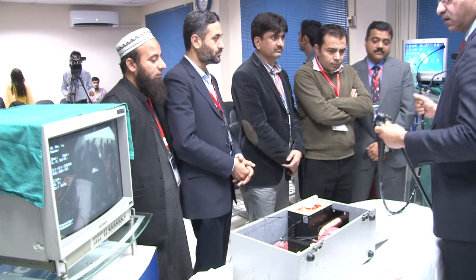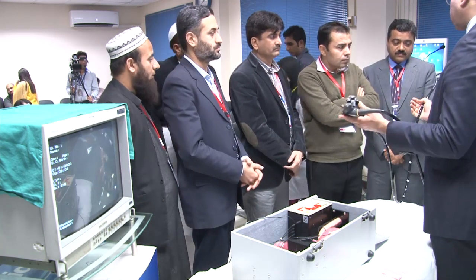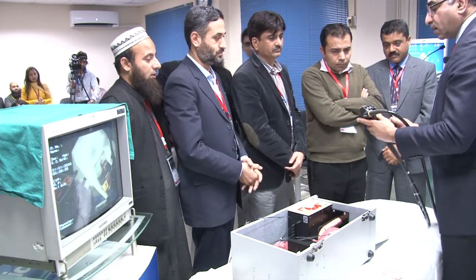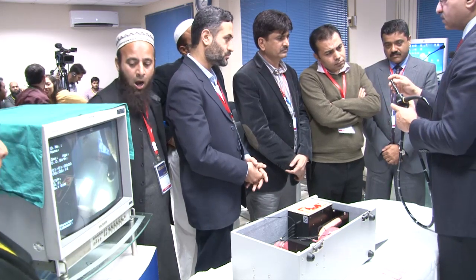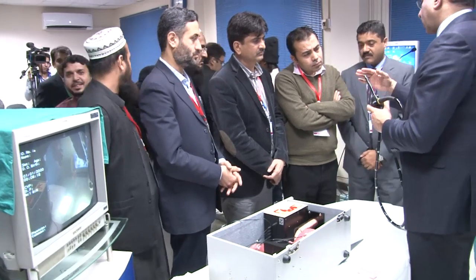Anatomy of the scope, right? So basically, whether this is a side viewing duodenoscope, you who have used it would know that, right? इसमें जो main जो चीजें हैं, एक तो ये है कि it has got the lens and the biopsy channels on the side, not at the end.